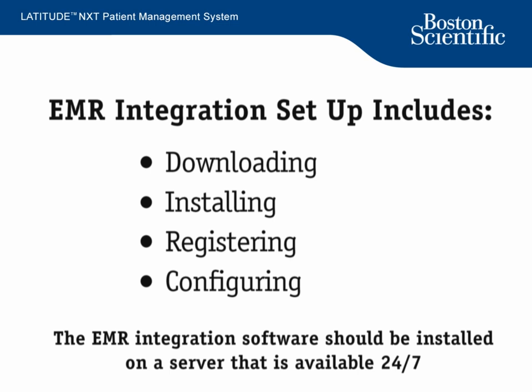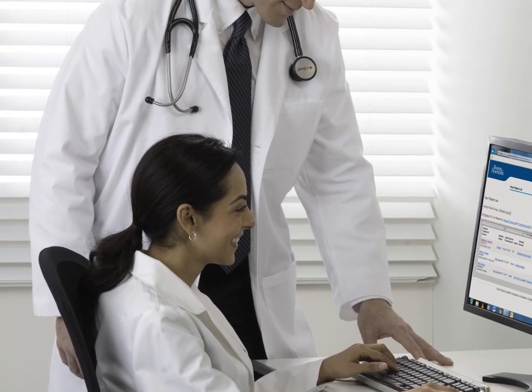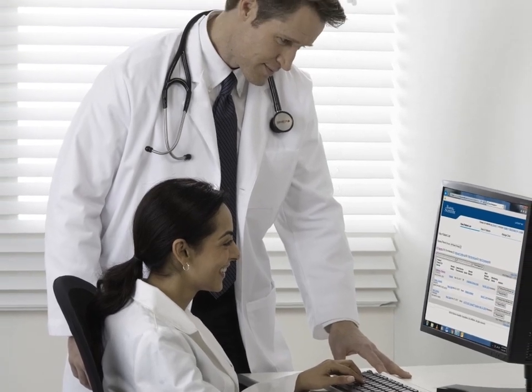The software should be installed on a server or computer in your clinic that's available 24/7 to allow for consistent data transfer. Before you get started, we recommend that you complete the EMR integration setup with your clinic's IT staff present, as there are some steps that may require his or her guidance.